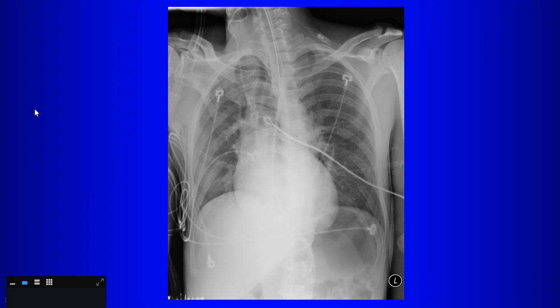Okay, so on this chest radiograph, anything important that we need to mention? Oh, is that a fracture? Where? The right clavicle? I can't see that. No, well, I mean, here's the distal clavicle over here. There's the acromion, so the acromioclavicular joint is in the right place. Nobody has anything to say?